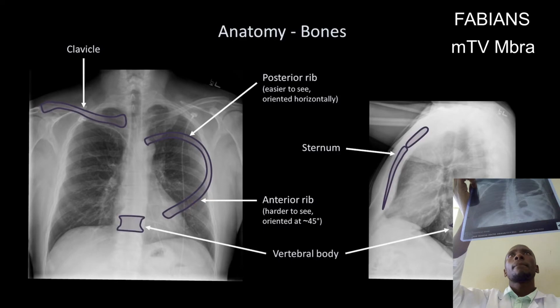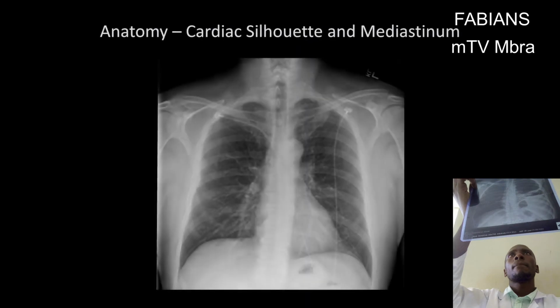Let's go to the anatomy of the heart. As I'm outlining it, let me outline the heart. As I've outlined the heart, you can see its position.